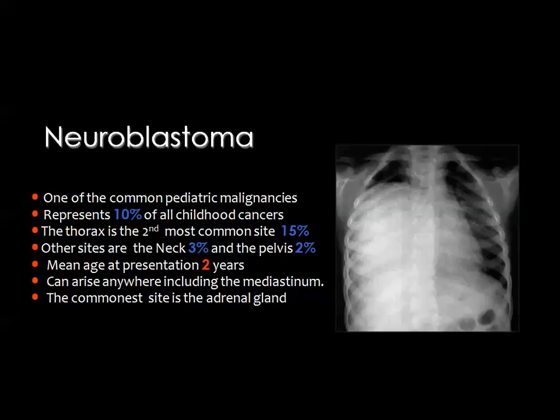When we discussed the diagnosis of pulmonary masses, we referred to the issue of neuroblastoma. Actually, neuroblastoma is a mediastinal mass, but is frequently seen on imaging as a lung mass because of its big size, and most of the posterior mediastinal tumors look like pulmonary masses.